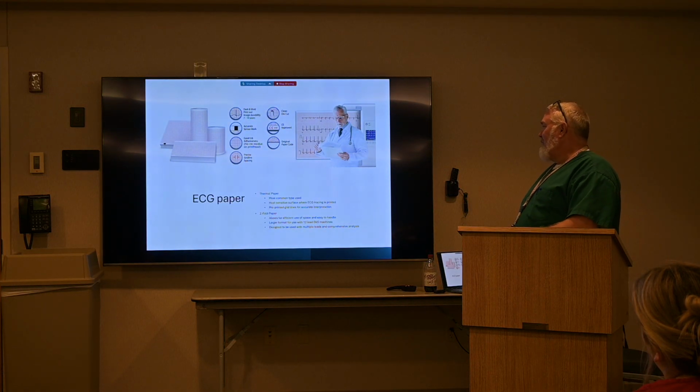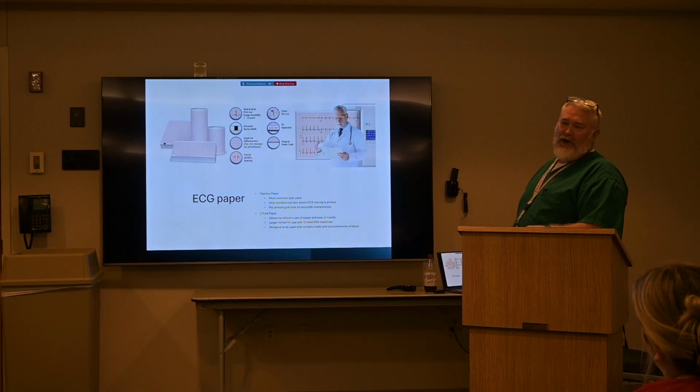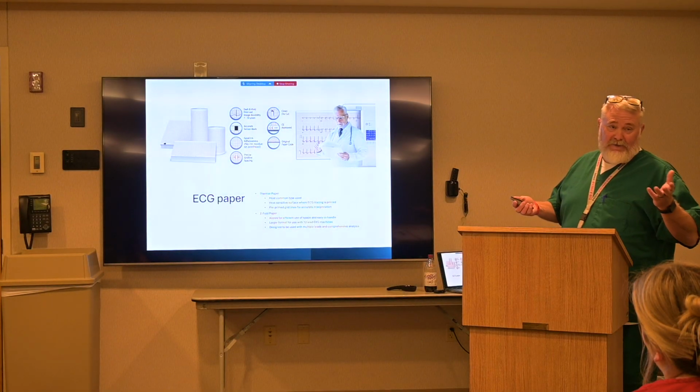So this is just something to know in regards to EKG paper, because it's different than any standard paper that we use.